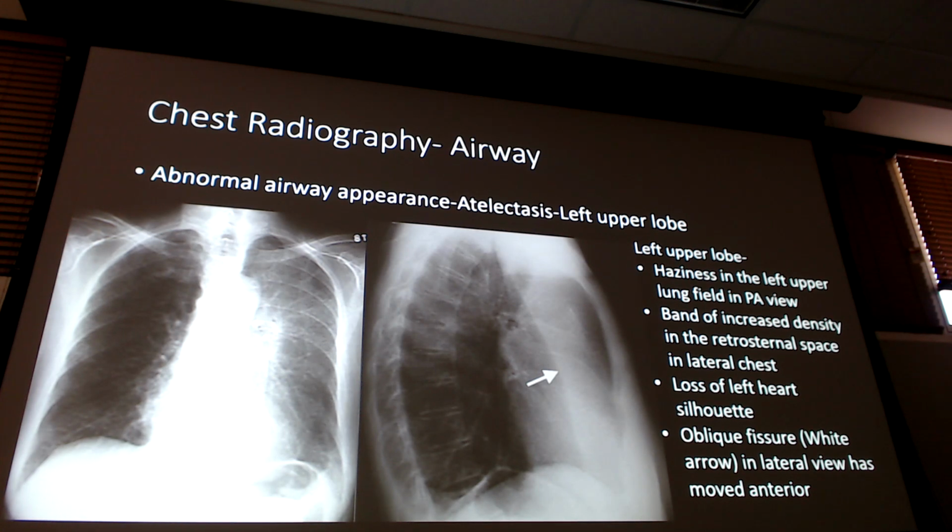Like this is the atelectasis. Yeah, I'll show you, right. So this line right here is your lobe. This is your fissure, right here. And so all of this is the upper lobe that has collapsed on itself. It's a whole upper lobe atelectasis. So here's your fissure line, big white arrow. This is the atelectasis, and this is that lower lobe that has come up.